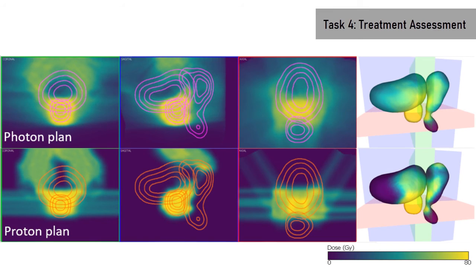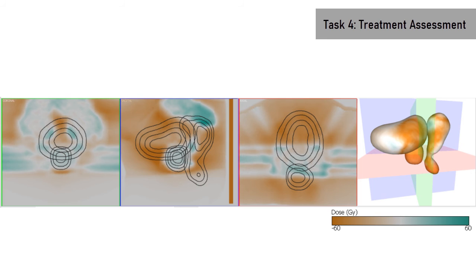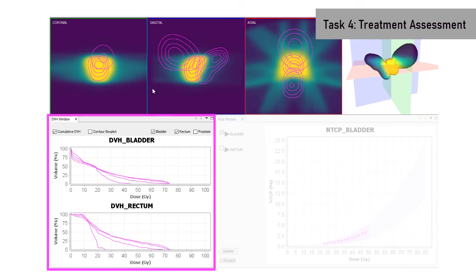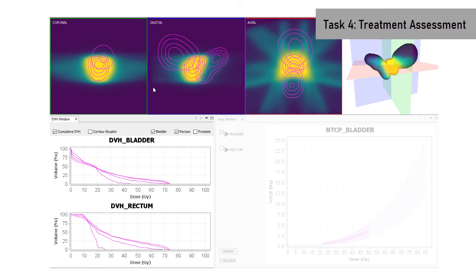If multiple treatment plans are available for the patient, they can be compared in terms of difference in spatial dose distribution. To evaluate treatment plans with respect to numerical guidelines for the acceptable dose limits for organs, dose-volume histograms are typically used. In our system we compute and show the dose-volume histograms for the 4 coverage probability levels of the inspected volume. We link them interactively with the anatomical views.